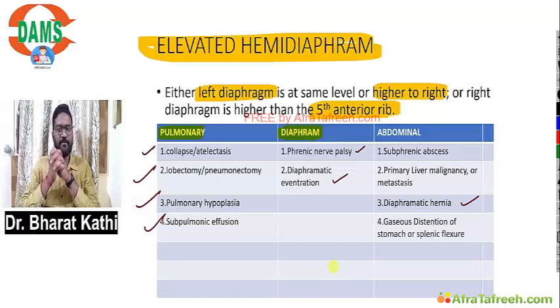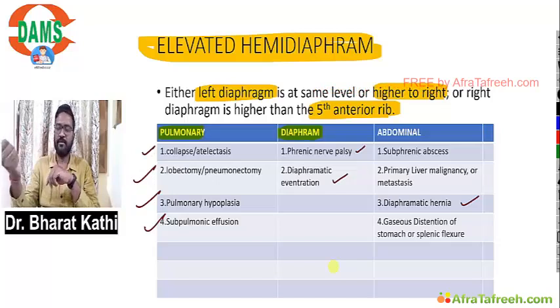Most probably for any regular exam, if you are thorough with these chest x-rays, it will be sufficient. We have also seen how to differentiate a hyperinflated lung from a normal lung. So go through these x-rays rapidly, and don't forget the points when describing any x-ray: what is the part, chest x-ray, PA view, exposure, rotation, adequacy of inspiration. Practice with your colleagues when reading a chest x-ray so that you will not forget in the exam.